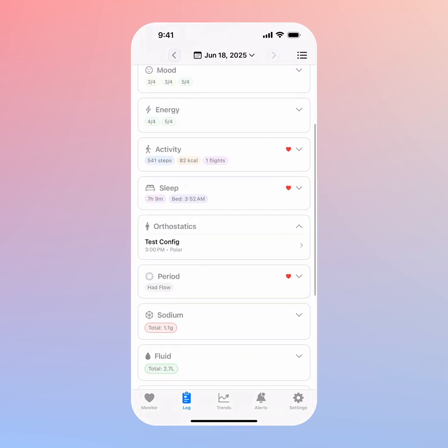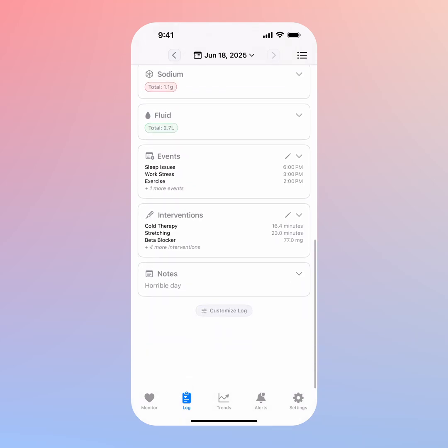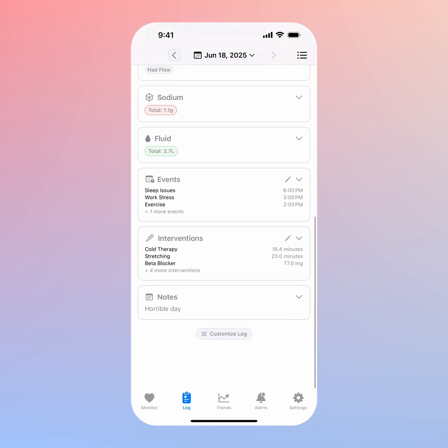And eventually I want this to be, so first it's important to note that all of this data lives on device. There's no backend or server, and it's not sent anywhere. So you can rest easy if you care about privacy stuff. It's very important.